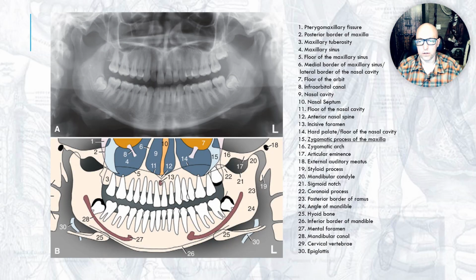All right, these are the structures that everyone should know. You should be able to identify a lot of these anytime you're analyzing a panoramic radiograph. I think back to when I was a general dentist, I didn't really know how to identify most of these, but really you should, and I'll show you why later. I'll start with some of the most important things I think you should know, which is being able to follow the maxillary sinus line. And I said in intraoral radiography that this is my favorite structure.